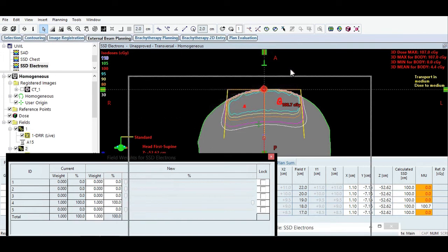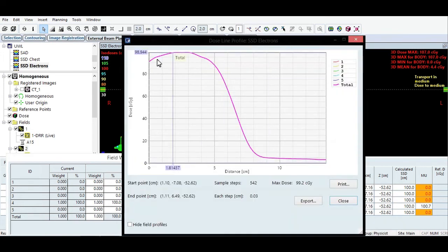And now if I look at my percent depth dose curve, my skin dose is still just north of 90%, but now at 16 and 20E it's going to be even more noticeable. At 16, you notice that I have this real broad range. So anywhere from 2 centimeters to 3 centimeters, I get 100% of the dose. And 90% of the dose basically goes from skin surface to almost 5 centimeters deep. If I trace down the tangent of the percent depth dose fall off, I get right around 8 centimeters for my practical range. The Bremsstrahlung long tail now is right around 3%.